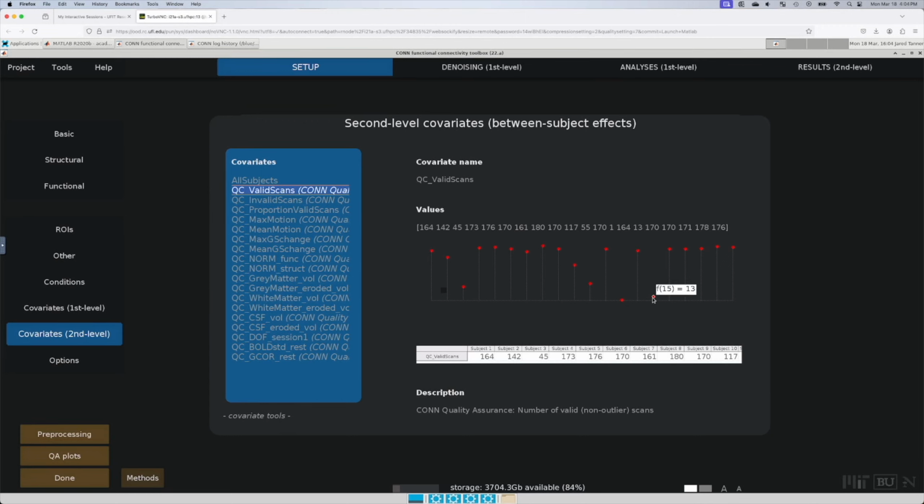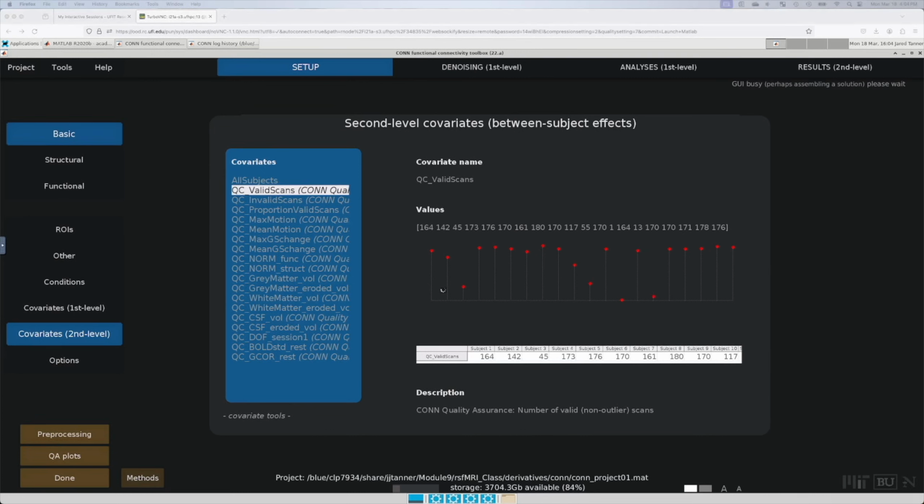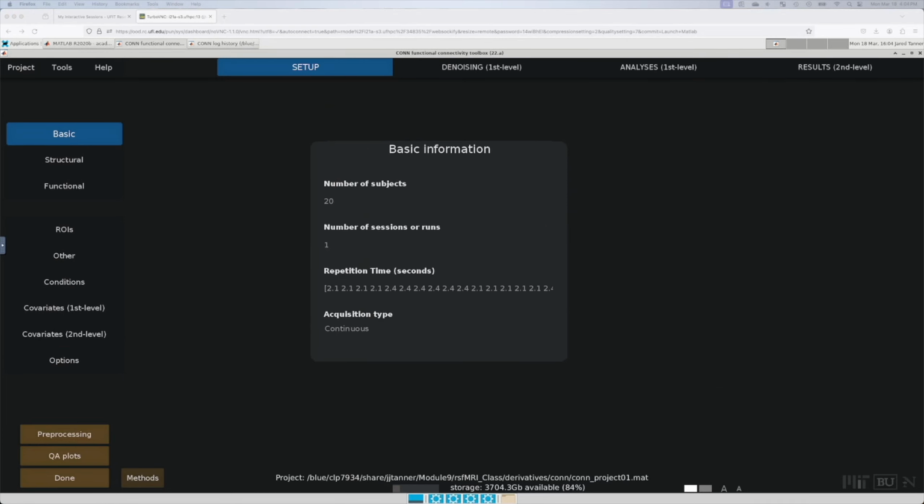That means we're losing 3 of our participants who have tumors, and we're losing 1 of our controls. So we're going to have 9 and 7. So 3, 11, 13, and 15. Okay, so we're getting rid of 4 participants.